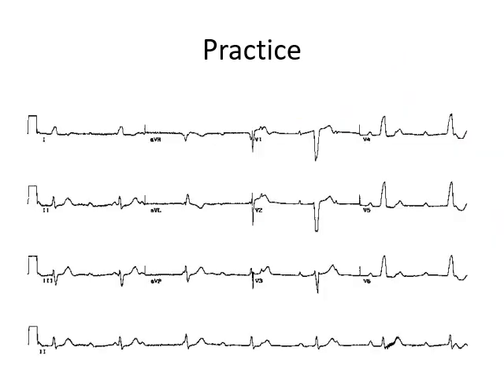Let's have a look at one more ECG. In this ECG, I'm going to take a 1 second pause for you guys to interpret it.